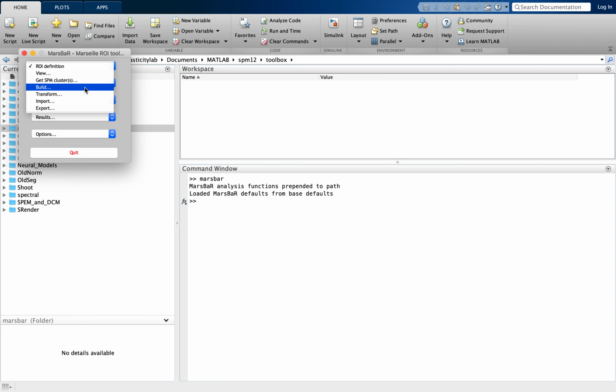In my case, I was interested in executive function, so I went on Neurosynth, wrote executive function on the bar, and downloaded their activation. Looking at that activation, I selected some areas that were interesting for me, and of course this area could be very big or can have different shapes.